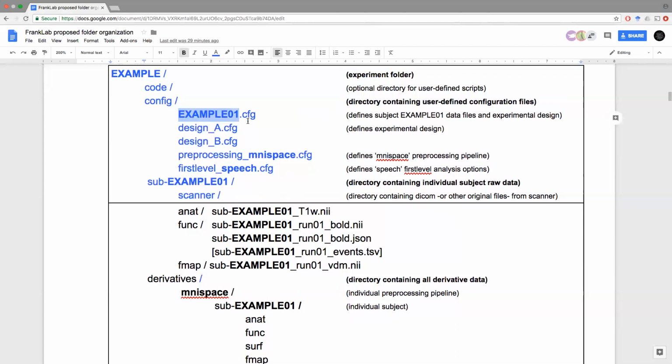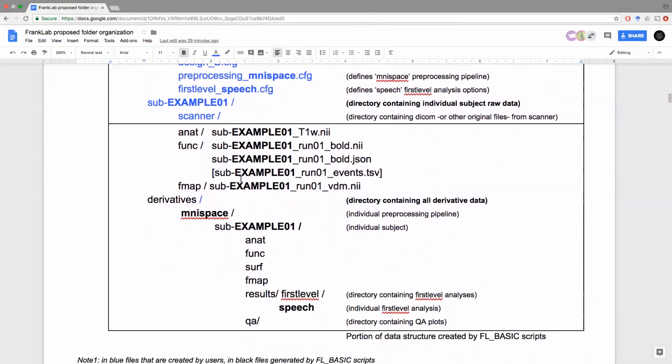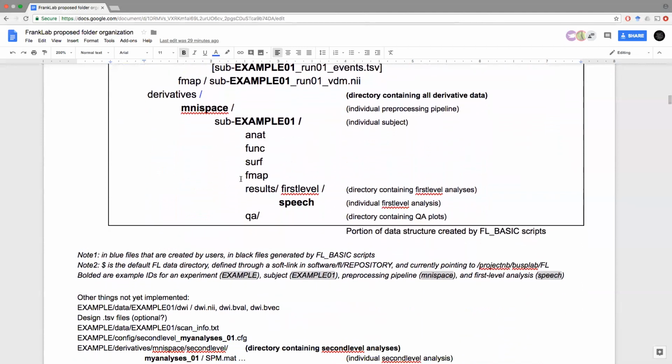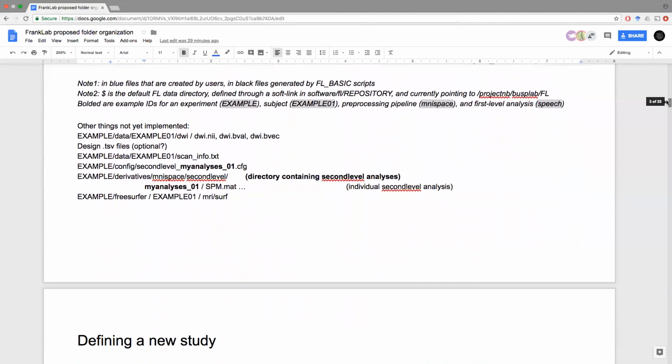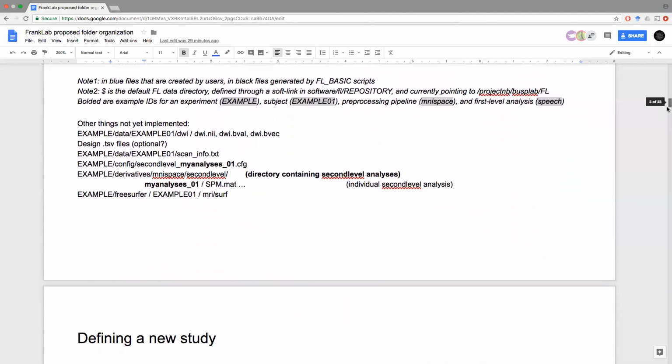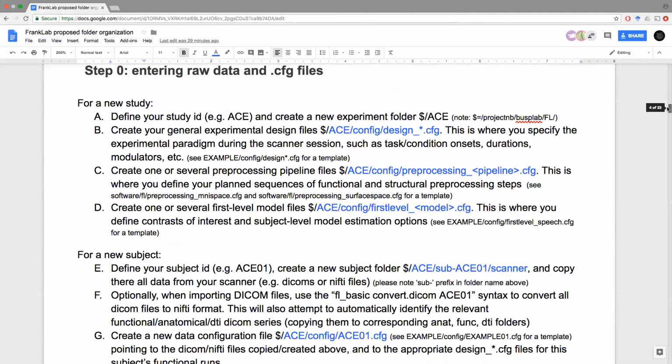Yes. And once you have that information, you will be able to run subject surface-specific steps during the preprocessing and during first-level analysis. So the next thing you need to do if you want to run surface-based analysis, in addition to actually pointing to that FreeSurfer stuff, is actually running a surface-based pipeline. So that goes in here.